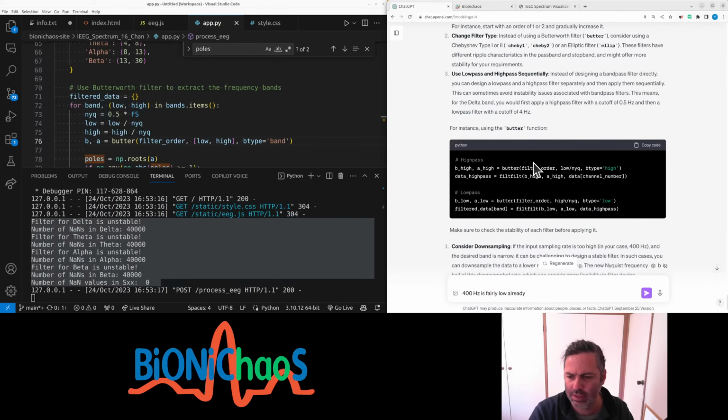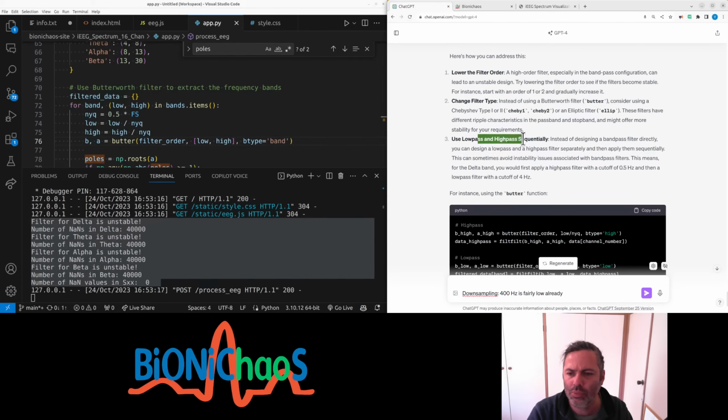So in regards to downsampling, downsampling fairly low pass, high pass sequential. That's a good idea.